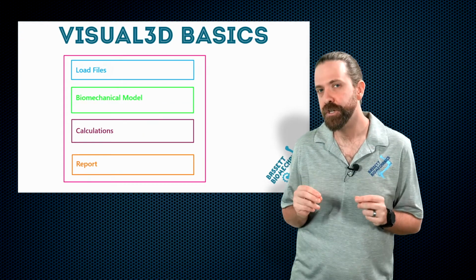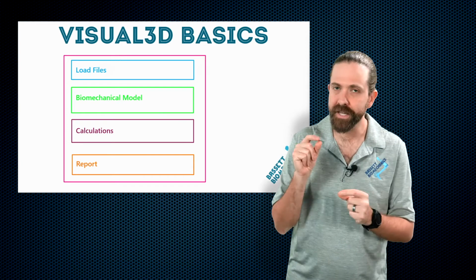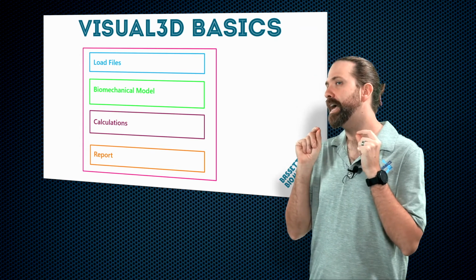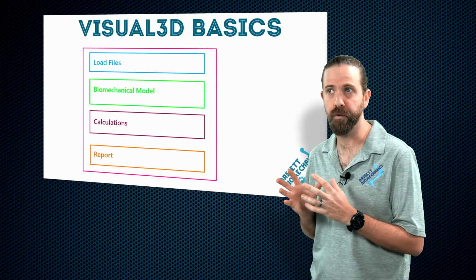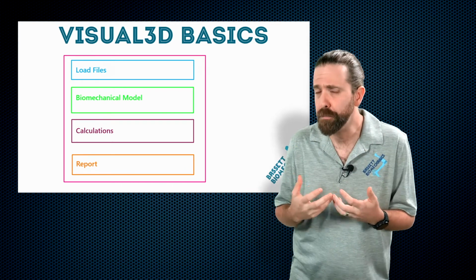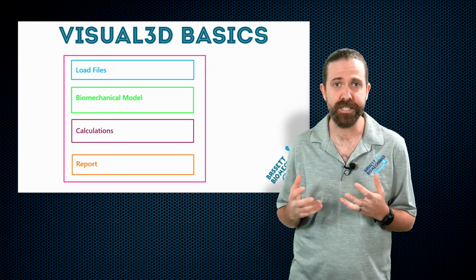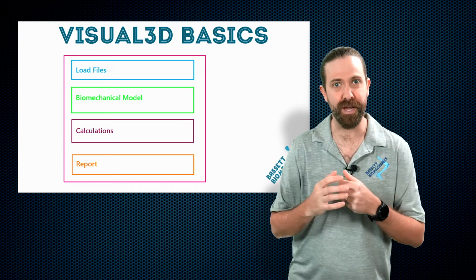Essentially, if there's something that we would do in Visual 3D, wherever we might go click to do something, there is almost for sure a pipeline command that will allow us to do that in an automated way. So in the next chapters of this unit, we're going to give you an example of how to automate a fairly simple data analysis, but it will be a good first exposure to get you started with pipelines.